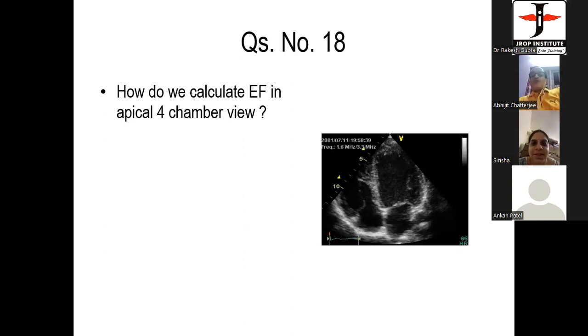Yes, sir. So you start at one annulus and end at the other annulus. And then join by a straight line at the base. Yeah. And take the midpoint of the straight line and what do you do next? We'll drag it and see that the whole area is covered properly.